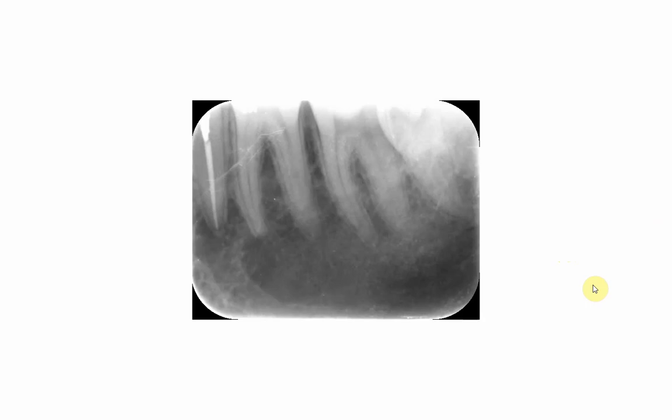Another radiograph where the film has been pushed too much downwards, we ended up with complete absence of the crowns of teeth, and the film has gone well beyond the apical part. The crowns can be seen in the clinical examination, because there are areas that can only be seen by a radiograph. That's why we are doing a radiograph. The film has gone much less than the 2 millimeter distance between the margin of the film and the occlusal surface of the teeth. So we end up showing a broader, larger area of the periapical area of teeth.